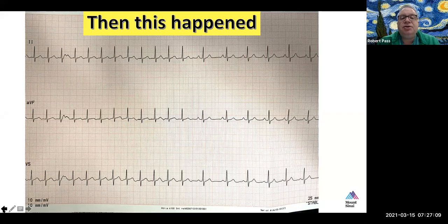You see the retrograde P waves, almost by definition, they are following the QRS. And so if you see retrograde P waves, usually that means it's ORT. What about the heart rate? Does that help at all?